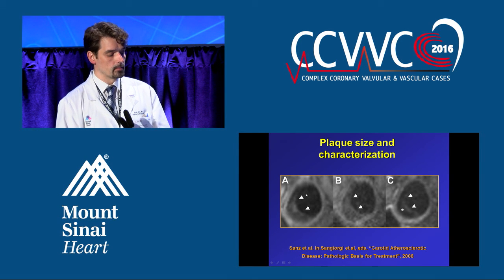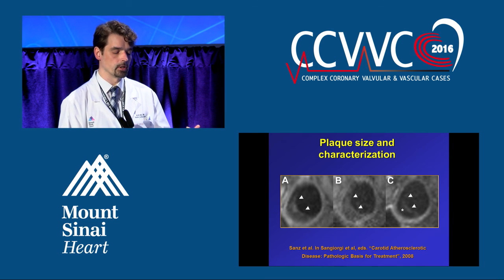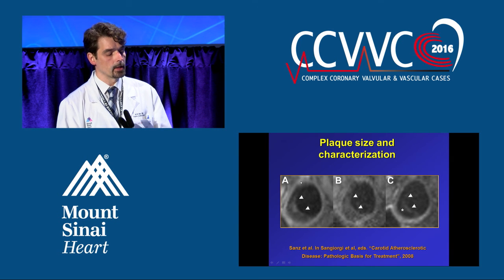So we can get the cross-sections of the vessel, we can calculate the areas and the volume, so we can look at some of those features that I told you about, large plaques with positive remodeling and so forth. And then we can do characterization.